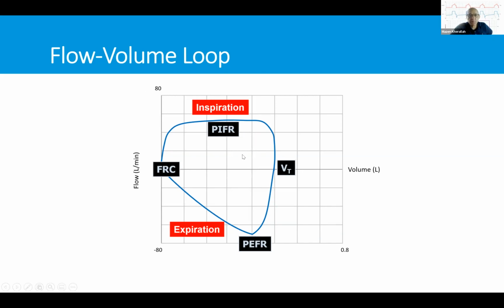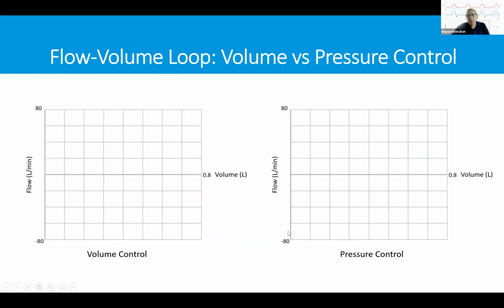So this is the reverse of what you see on spirometry in PFT labs. Expiration is down, inspiration is up. This is what we have in the ICU.